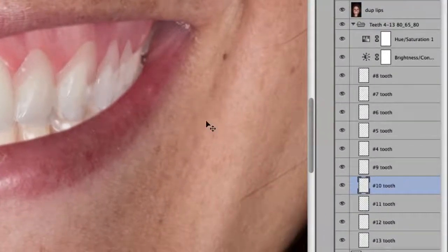Great. And now I got to do something with tooth number 11. So I highlight tooth number 11. I at least have to move it over. I'm going to use the left arrow and move it over. All right, you can see that we're going to be at this length. We're not really going to be lengthening the canine. And let's just say you still thought it was a little too wide over here. This was a little bit of a problem for you.